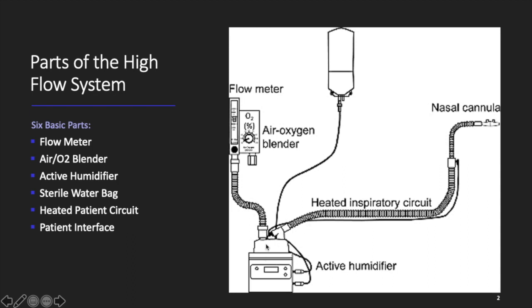We then have an active humidifier down here below. Usually on most models it's the basic Fisher-Paykel with a heated wire and then a temperature probe proximal to the patient. That's just going to provide us with heat, and then we have a heater dome that's disposable and goes in the bottom that's then filled with water. So that's our basic humidifier there.